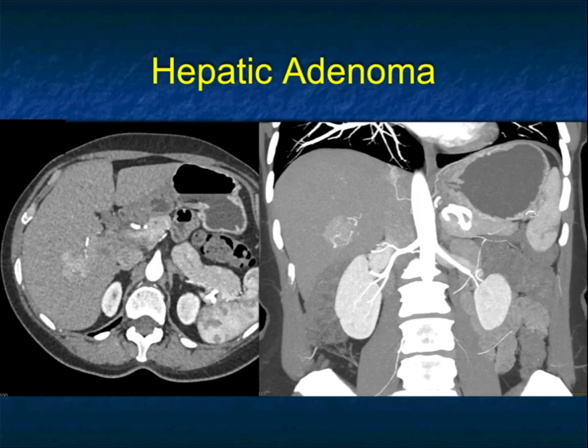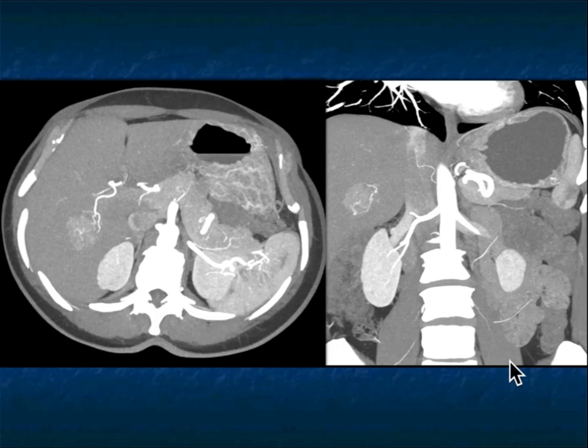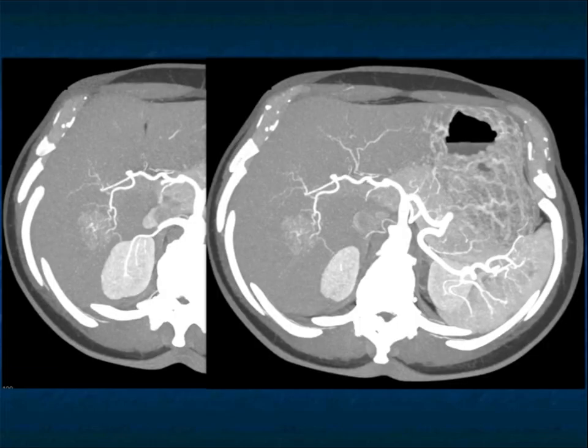There's a vascular lesion, right lobe of liver. When you look at the MIP, you do see some puddling vessels. And if you look at this image, it's vascular and has these slightly irregular vessels. It does not have the appearance of hemangioma. That's easy. You could think about FNH, but it's not as smooth or homogeneous as one would like.